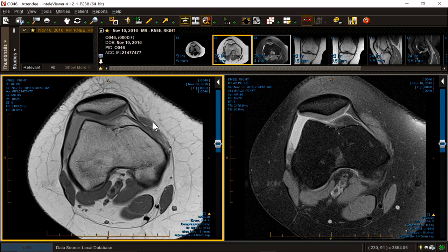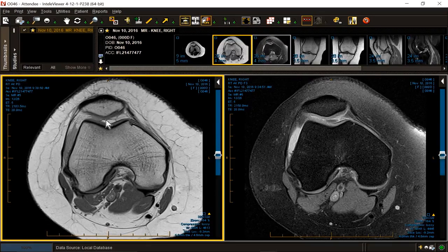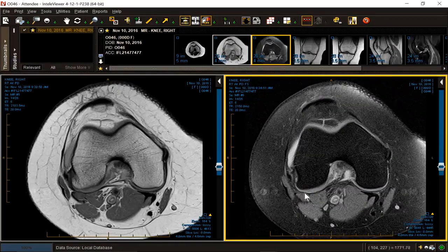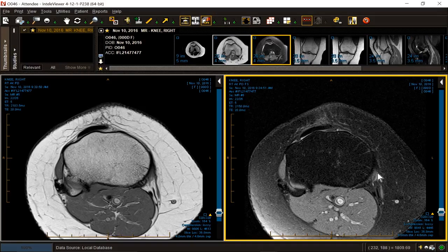The reason for it is the medial vastus is underdeveloped compared to the lateral vastus and lateral structures, which contract and pull the patella over. Previously, we said we could look at our tibial collateral and the axial. It's fine. Do we have swelling in the posterolateral corner? We don't. Our posterior ligament, our oblique popliteal ligament is intact. Our popliteal fossa is normal. Our semimembranosus looks terrific. Looks great. There's no swelling there. Oh, maybe just a twinge.